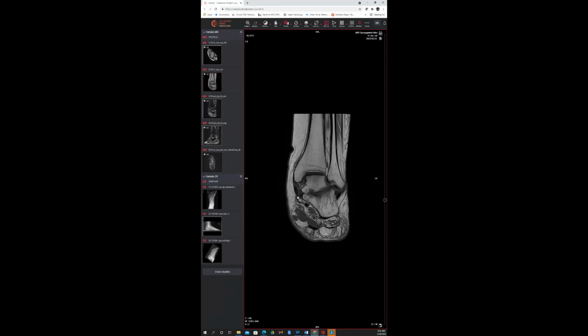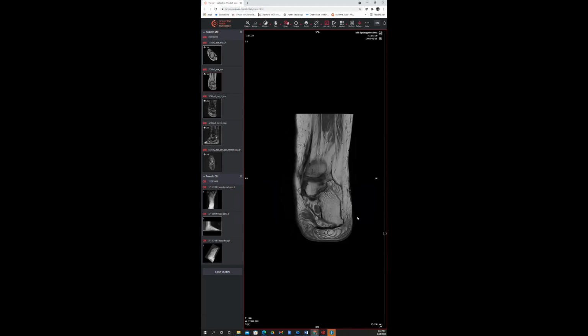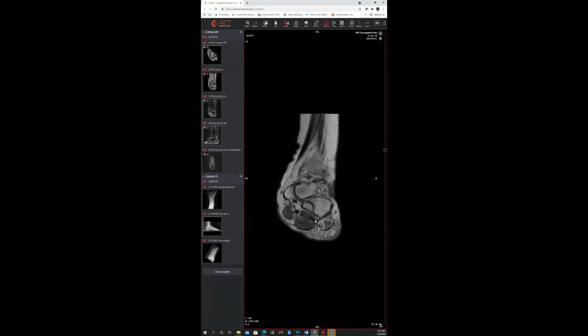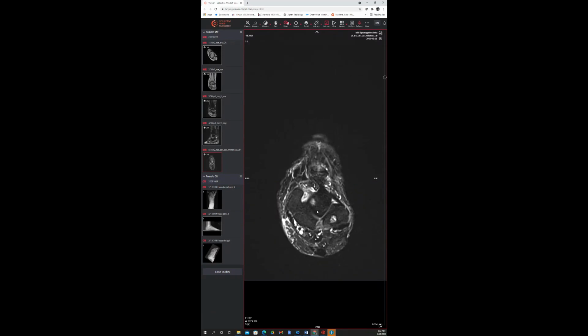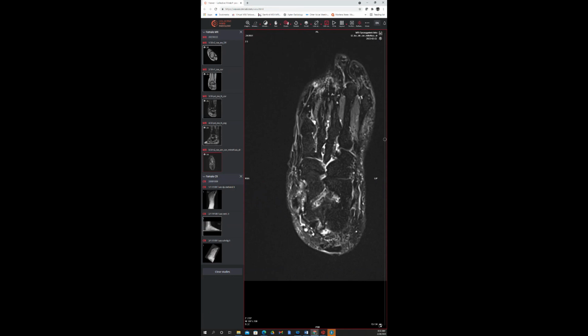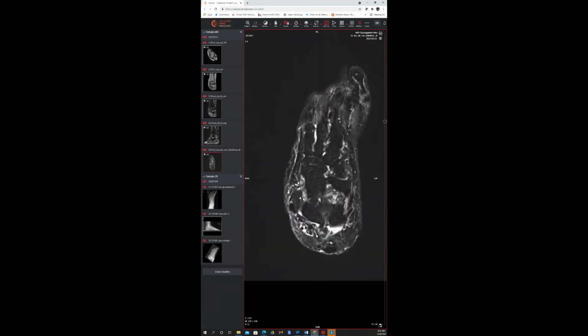And when we look at a situation where we drop a bisection of the tibia, we can see that the vector of the calcaneus is to move away in a situation of a hindfoot valgus. So we have this situation of pes cavus with a hindfoot valgus, and that can give us a very exaggerated biomechanical outcome. So when we zoom up on these structures, we can first, if you get a sense of the medial flexor tendons, the posterior tibial, the flexor digitorum, the flexor hallucis, what we see here is basically quite chronic tendinosis, mild.